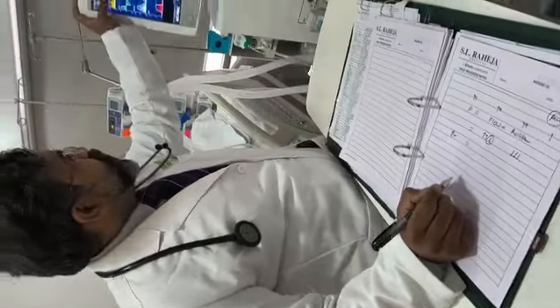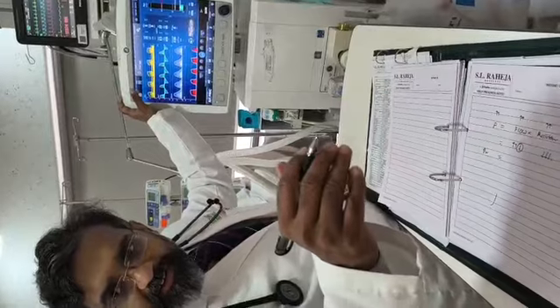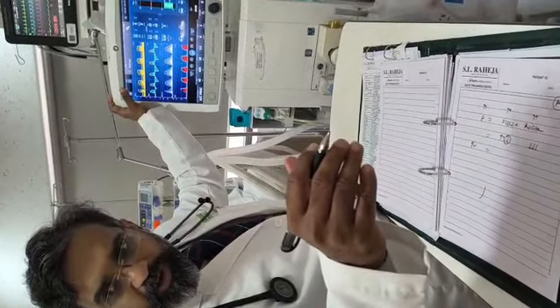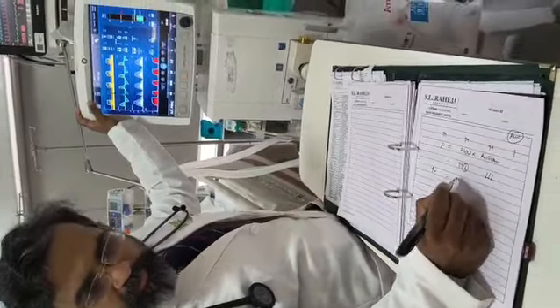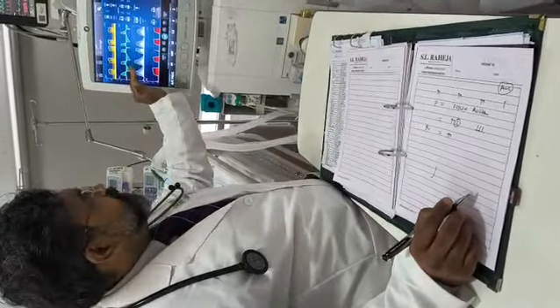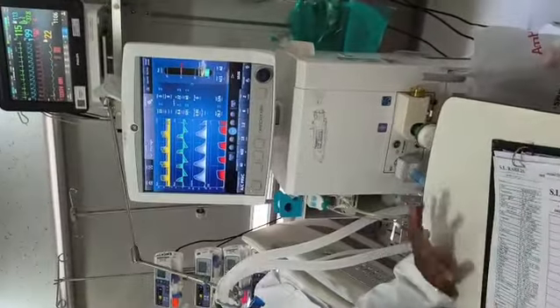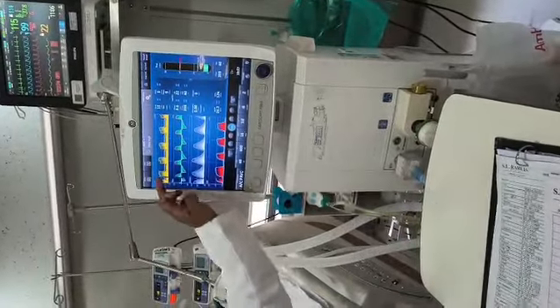And so we see this small drop over here, but then subsequently it needs to pressurize the circuit to the same amount that we have set on volume control mode. That's why it goes up on the flow, and the resistance goes back to what it was. That's why PRVC shows this kind of artifact, and this artifact is called a flow artifact.